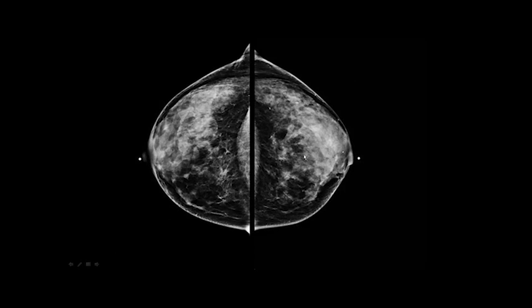All right, here's another example. So we're going to look at our imaginary line, our horizontal imaginary line, and make sure our nipples are centered, which they are. You have retroglandular fat. You want that circle.